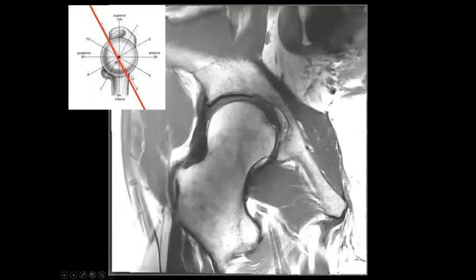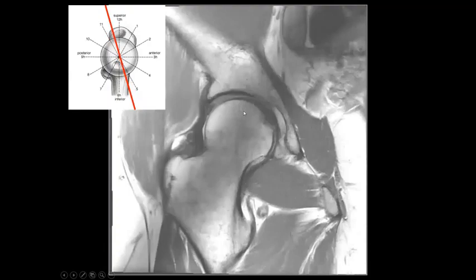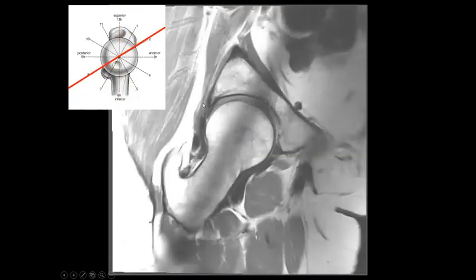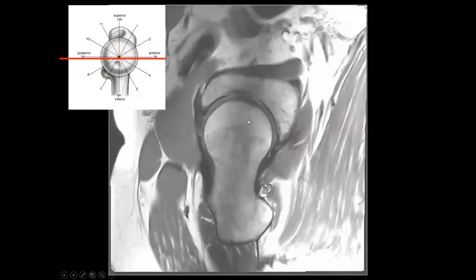But these are thick slices. These are not isotropic slices. These are very thick slices, and they are performed in this manner. They are performed using the clock face manner. And we keep going until we cover the entire acetabular clock face of the acetabulum and the labrum.